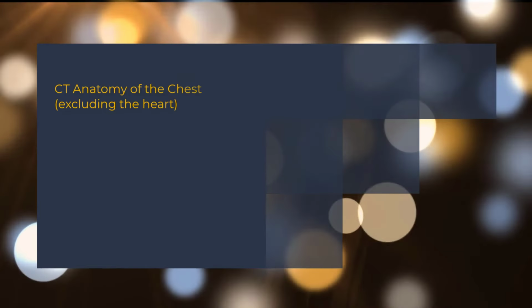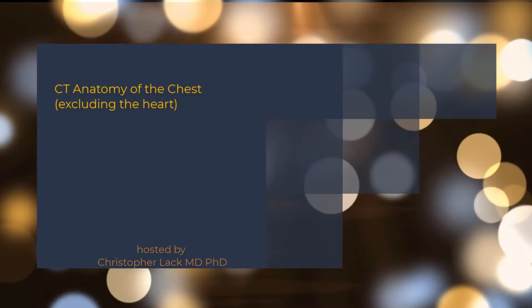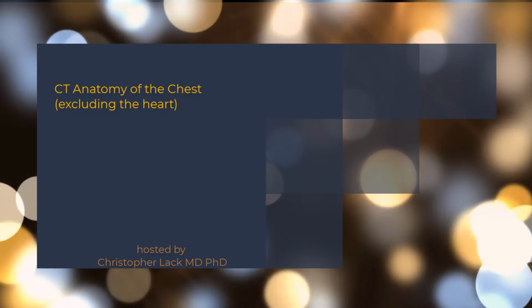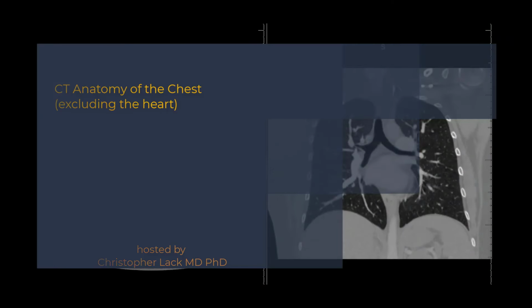Hi, I'm Chris Lack, and this video is to serve as an introduction to the anatomy of the chest CT. This will be the first review video that we do for the anatomy course during first year of medical school, but this video can also be used to refresh your chest CT anatomy.